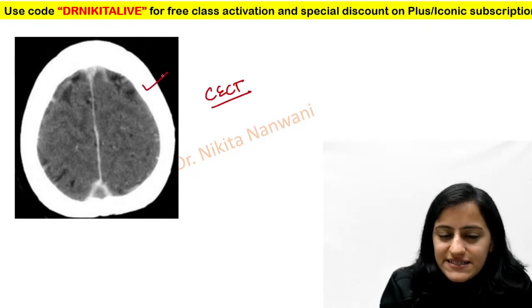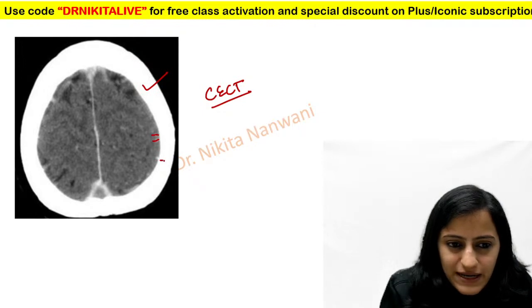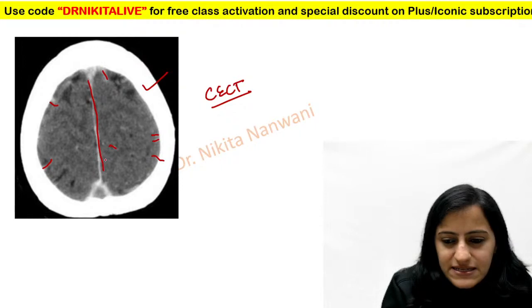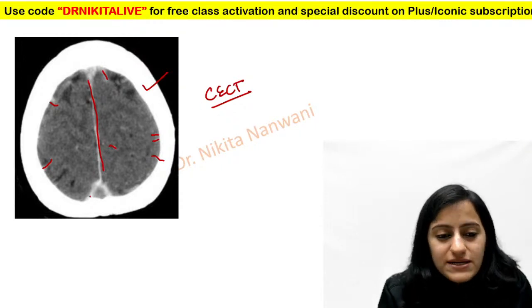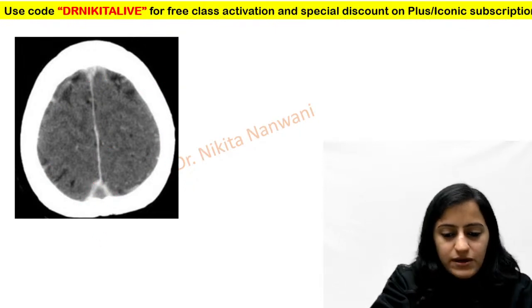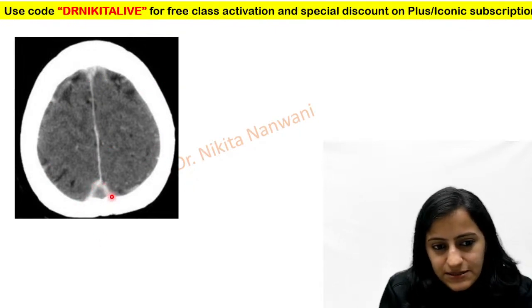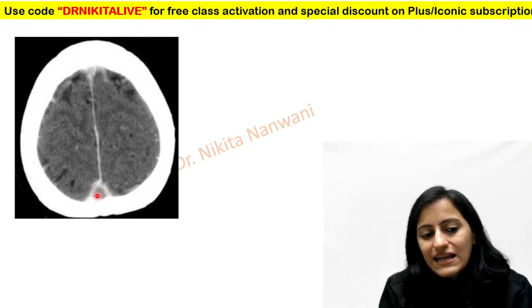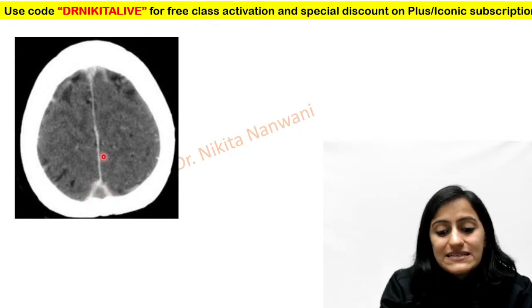This is a CT scan. You can see these white blood vessels here, right? These are the blood vessels. You can see here as well. On a contrast enhanced CT, you can see in the posterior part here, this is a triangle, right? This is a triangle which is white only in the borders. The inner part of the triangle is empty.